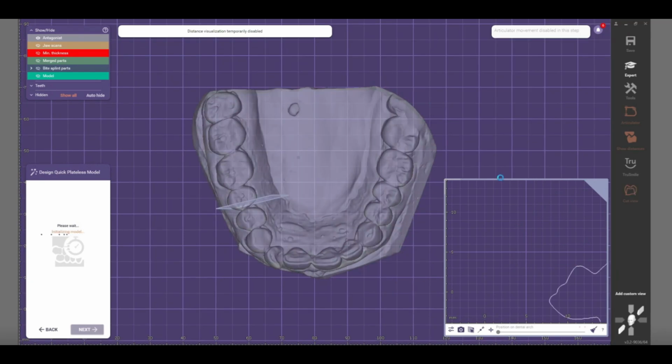So it automatically created that. It automatically gives in the holes on the model. You don't even have to put anything yourself. So it's created both of them, and so we're calculating.